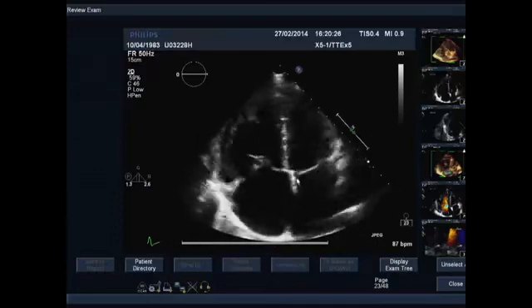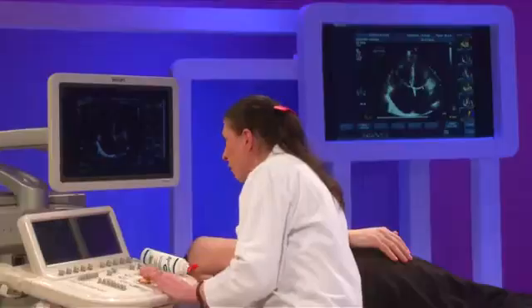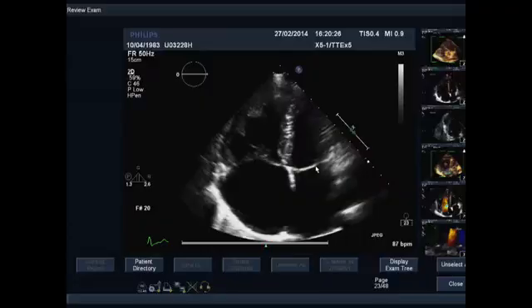If you have an atrial septal defect ostium primum, it will be located at the level of the tricuspid and the mitral valve, and frequently you have to check both valves because you will have abnormalities of the valve like a mitral cleft, and of course mitral regurgitation and tricuspid regurgitation.